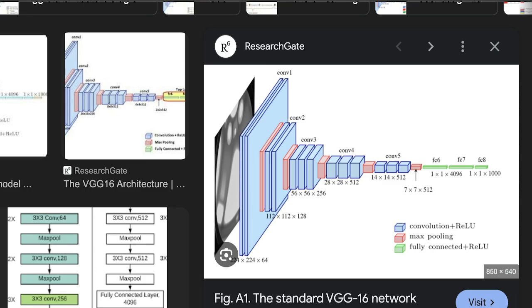So while building our model, what we are going to do is freeze these convolutional layers, that is the pre-trained convolutional layers that can detect any kind of feature, pattern, shape, structure from the images, and we are just going to change the 3 fully connected layers, and add our own manually constructed layers there.